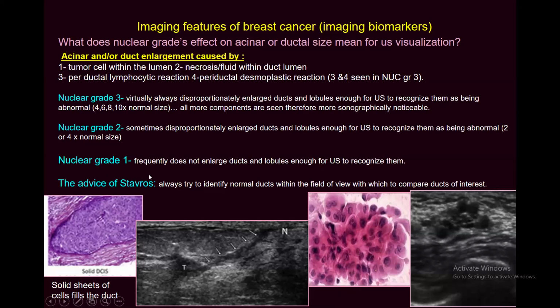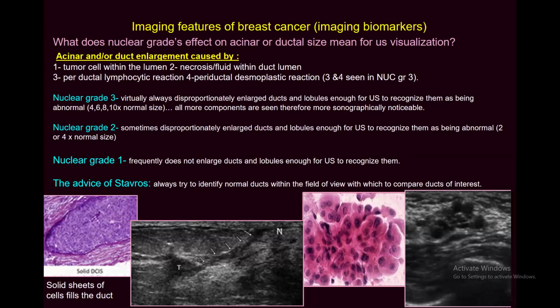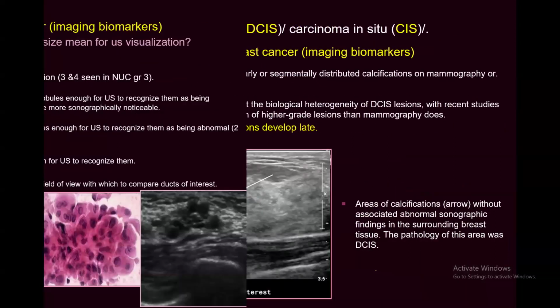But the low grade frequently does not significantly enlarge the ducts or lobule enough to be visualized on ultrasound.